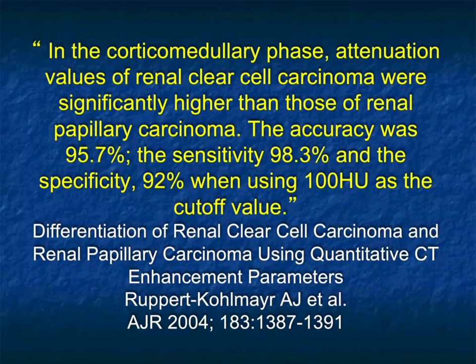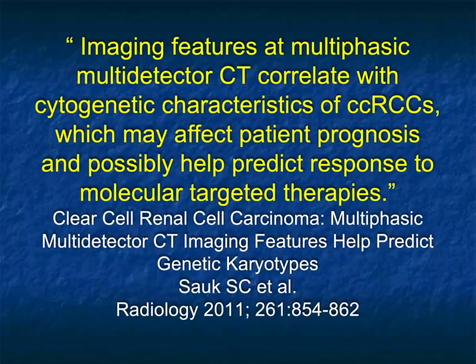Attenuation as representing a clear cell renal cell carcinoma. Now, yes, I've seen a couple cases of papillary over 100, but it's exceedingly rare. And yes, I've seen a couple cases of clear cell under 100, but this 95% plus accuracy is totally our experience as well.